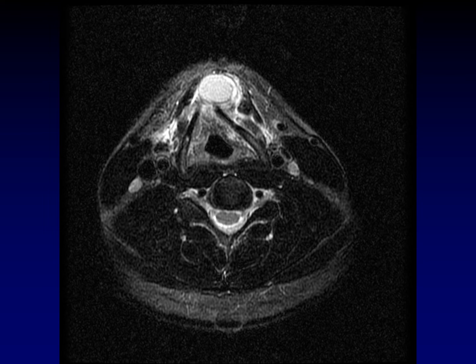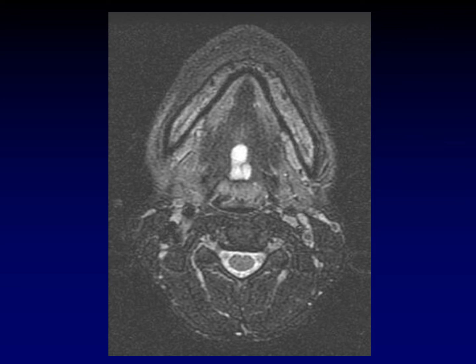Here's the T2 on that same patient, and you can see that there's a lot more going on beyond just the cyst itself. All of this additional inflammation in the strap muscles, even extending into the larynx, this is indicative of acute infection of this cyst. Of course, this patient will have to be defervesced before surgery is pursued. Here is another potential location for thyroglossal duct cysts that is really important to remember.